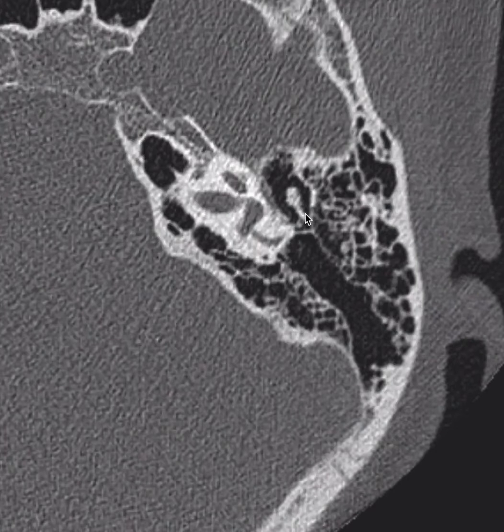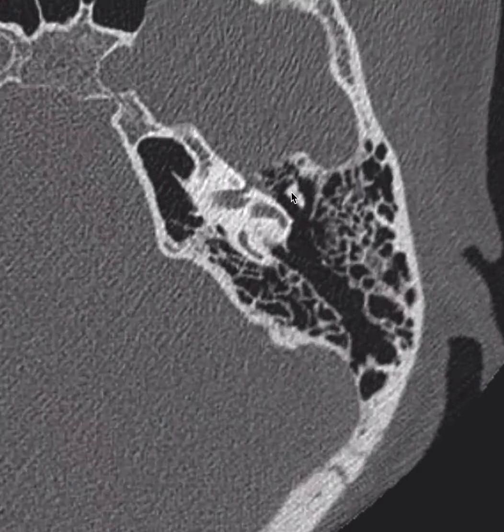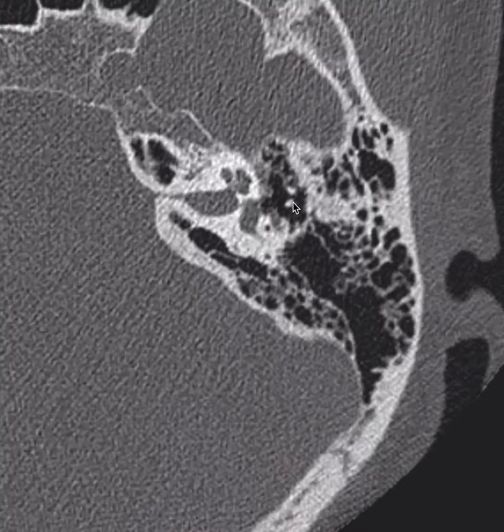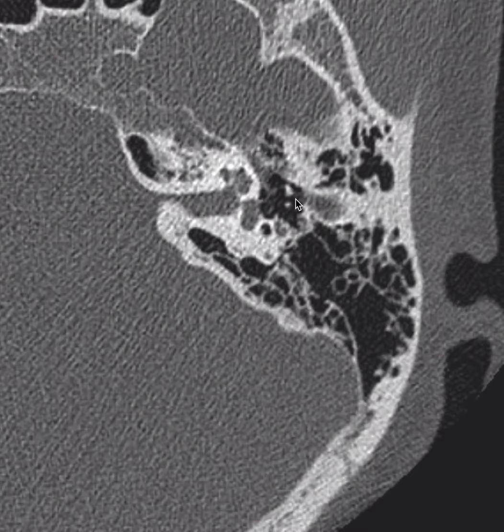I'm going to scroll more superiorly again, and we're going to watch the malleus. Now the malleus, as I scroll inferiorly, will become the neck right here. The neck of the malleus I mentioned earlier will be in contact with the lateral mallear ligament right here, which forms the superior boundary of Prussak space. Also, medially, it has another important attachment to the tensor tympani tendon right here. The tensor tympani tendon comes off of the cochleariform process here to get over lateral to reach the mallear neck.